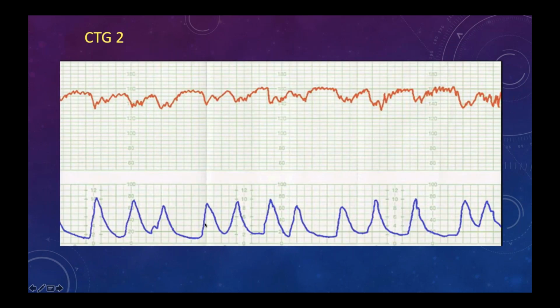Now, who will do this trace? One person. Can I try, ma'am? Yes. I have got enough traces, everyone will be able to do. You can write who wants. One person keep on writing here. So who is doing? Yes, Dr. Tanya, you do this. Yes, ma'am.